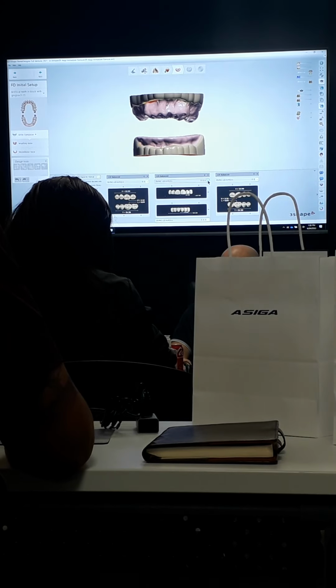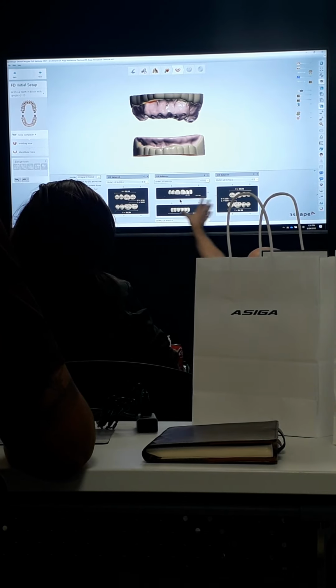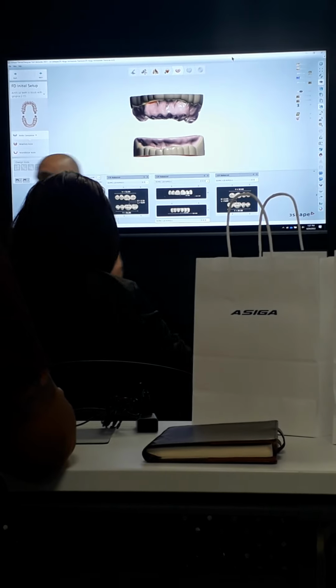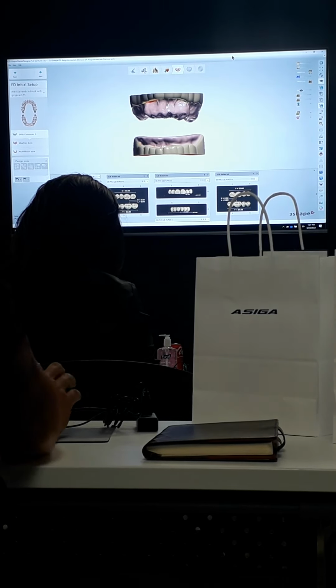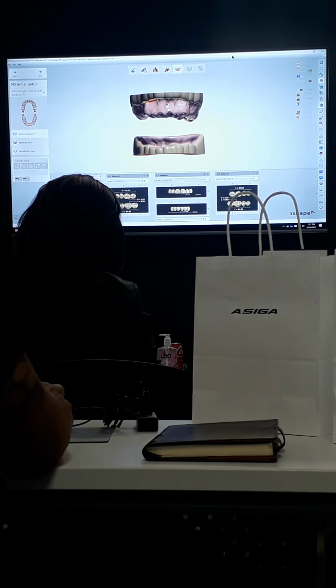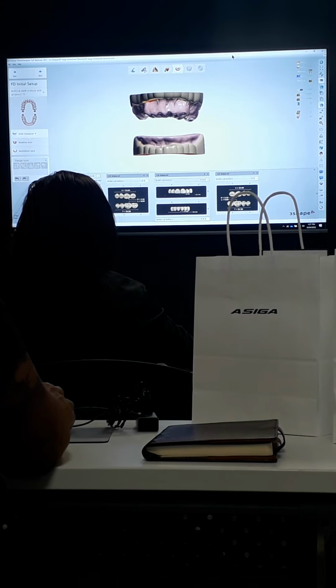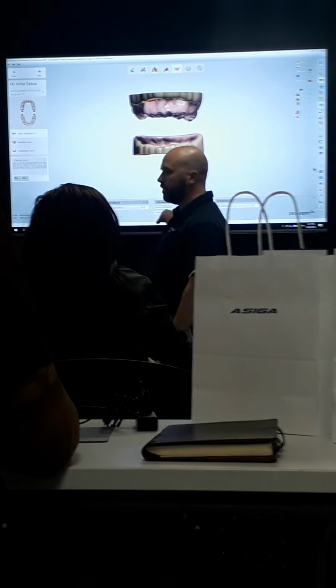What if it doesn't show? It doesn't show these libraries here, these cards. Do you have the Show Full Arch Libraries checked? So check that off and then you should see everything. Show up now? Yeah. Yeah, so choose the one of the just HC library or something. Yep. And then check that. Is anyone else's library showing up like Digital with no cards listed?